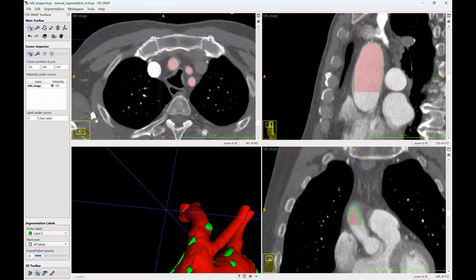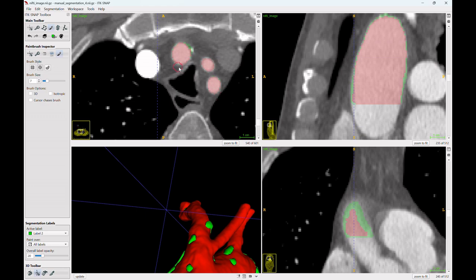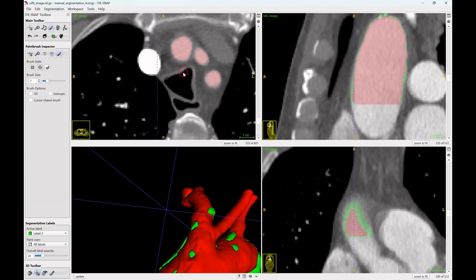We will now remove unnecessary thrombus, that is, small isolated regions that do not correspond to real thrombus but rather to the vascular wall. A quick cleanup is sufficient. Delete only the zones where it is clearly evident that no thrombus should be present, while avoiding the removal of regions close to calcifications, as these must be preserved.